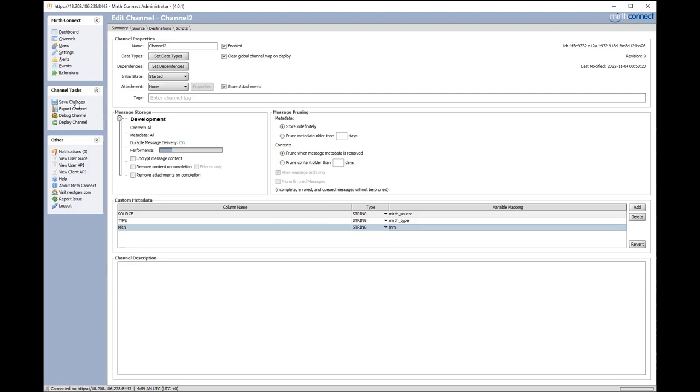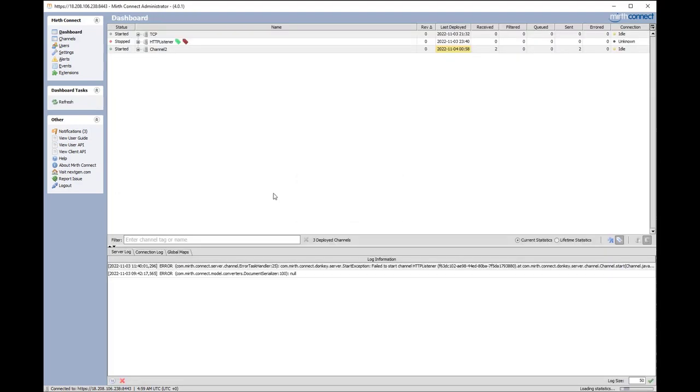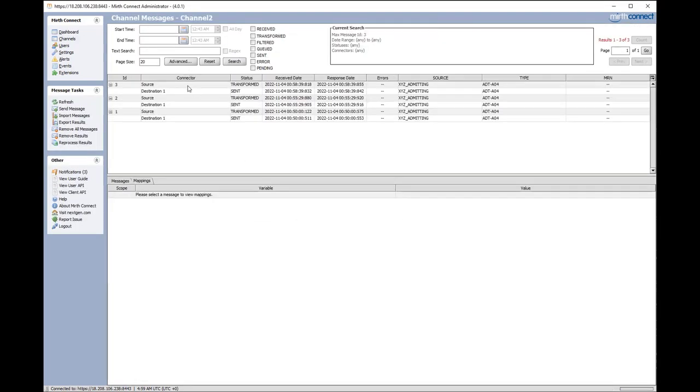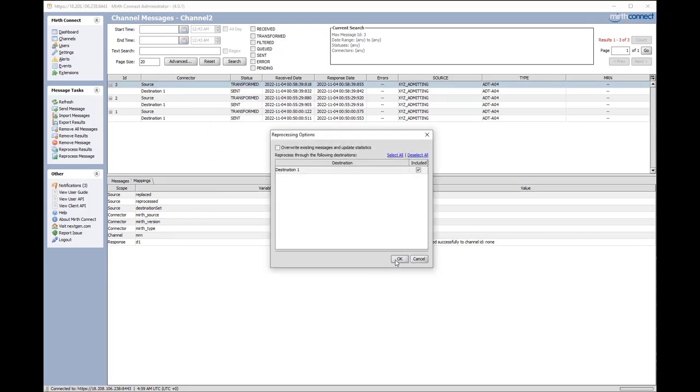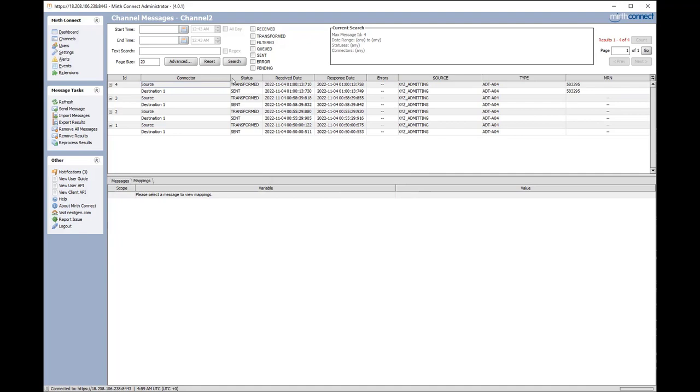Okay, we'll save changes, and let's deploy the channel again. And we'll need to reprocess a message. So now you can see MRN showed up right here.